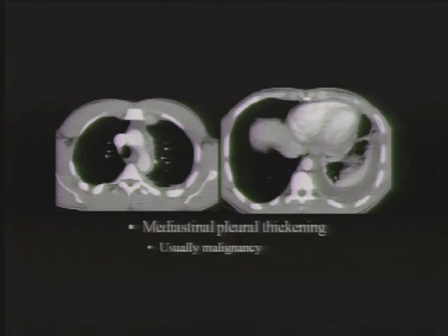So this is my final case, and we have a person with a loculated effusion, and he has mediastinal pleural thickening. And so that's a finding which is associated with malignancy. But actually, if we look here, he's got an enhancing pleura with subpleural edema. It looks like he has the split pleural sign. That's usually associated with empyema. So we're getting a little bit confused here.